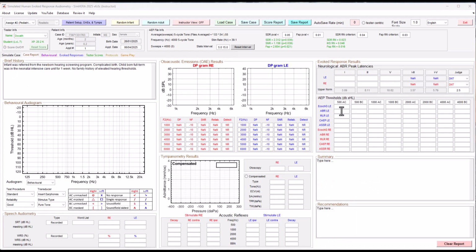So we're doing ABR left ear. We have dB EHL levels less than or equal to 25 dB because they were at that maximum stimulus intensity that we expected to see. Same thing for the AC for 2000 and 4000. We did not do bone conduction because we were at the maximum stimulus intensities for normal hearing here.